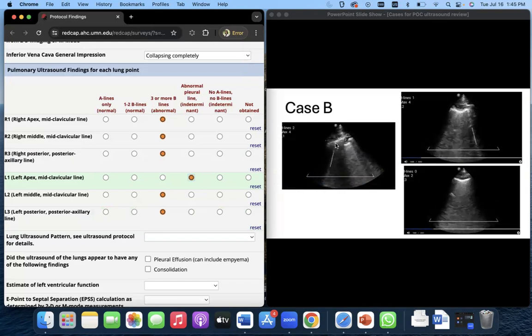Otherwise, if you do feel comfortable saying that, yeah, I see that there are enough abnormal B lines coming from what appears to be a moving and intact pleural line, there certainly does appear to be more than 3. This is one of the challenges with interpreting ultrasound images. Sometimes you see things you don't know exactly what to do with. But very specifically, that image there is called a subpleural consolidation. It's consistent with an infectious process, usually at the edges of the pleura.